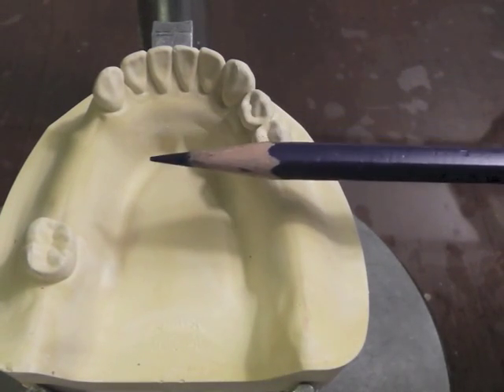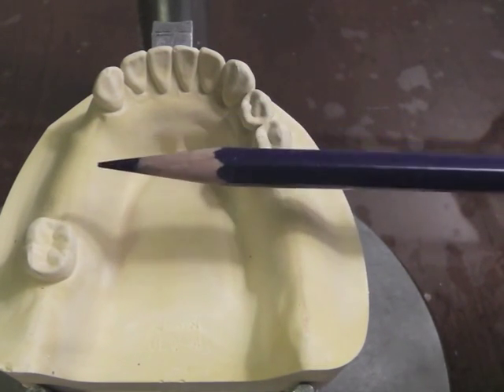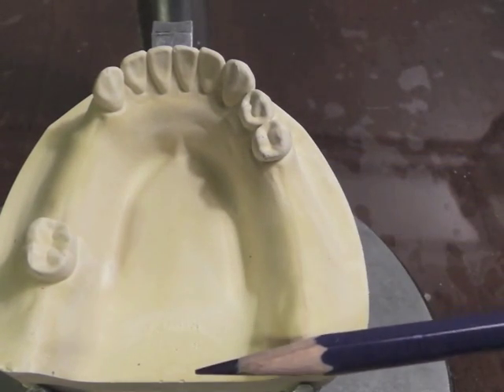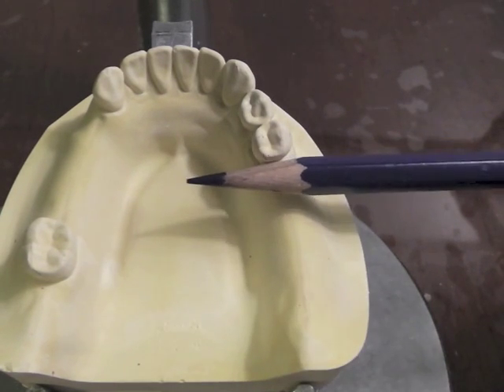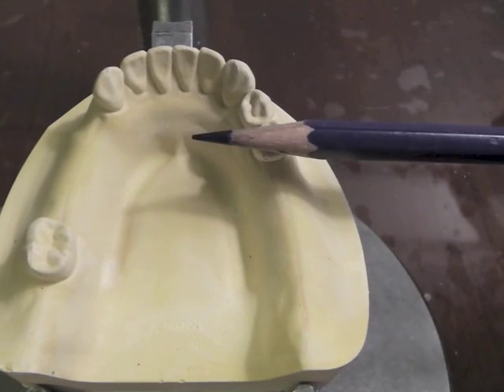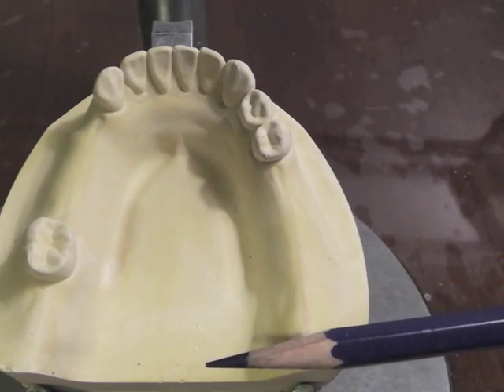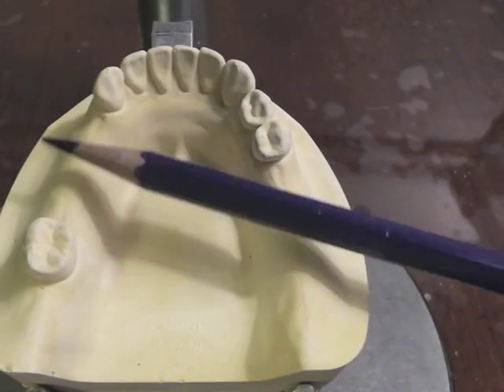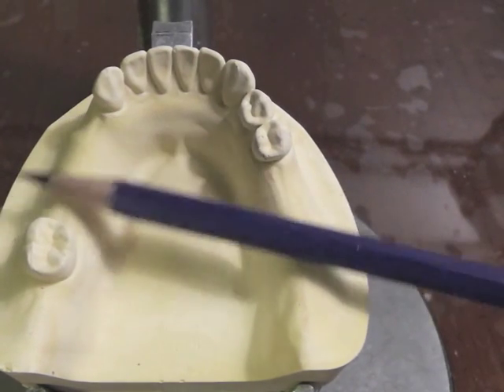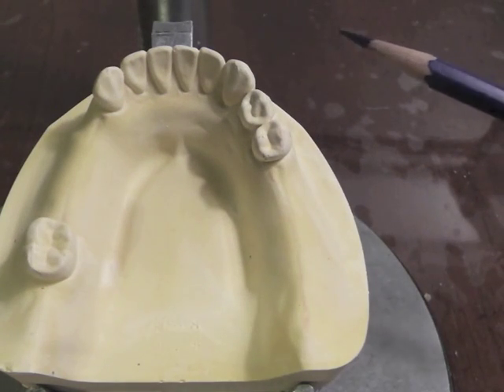We have to look at the most posterior edentulous area to determine our classification, and we will replace these teeth back here. So this is the most posterior edentulous area, and what we have is a single edentulous area posterior to the remaining natural teeth. That, by definition, is our classic Kennedy Class 2. We do have one other edentulous area that helps and is not in determination of our classification, so this would make it a Kennedy Class 2 Modification 1.